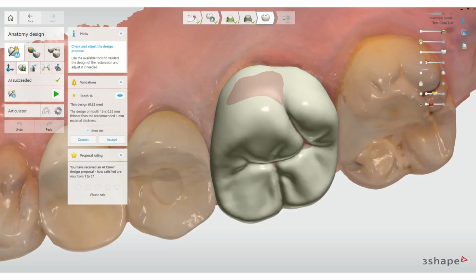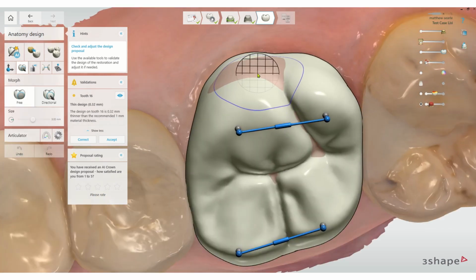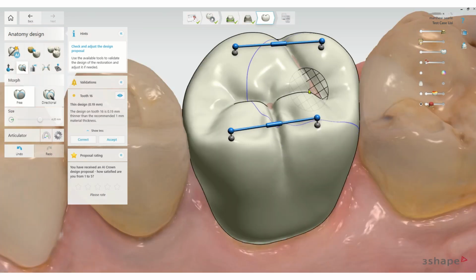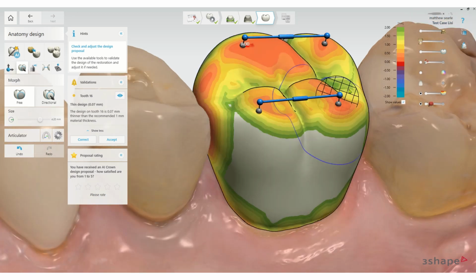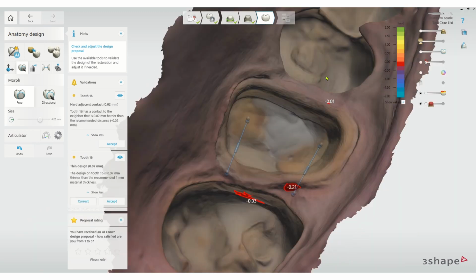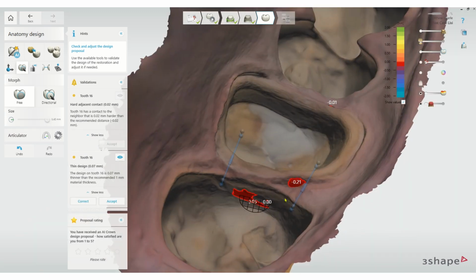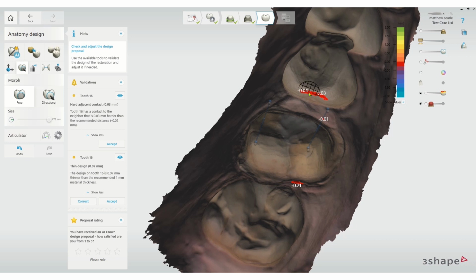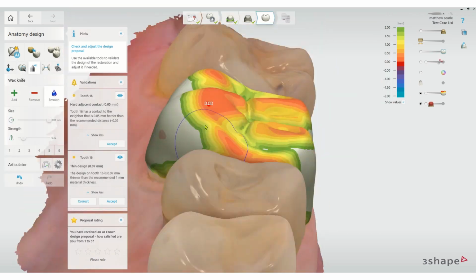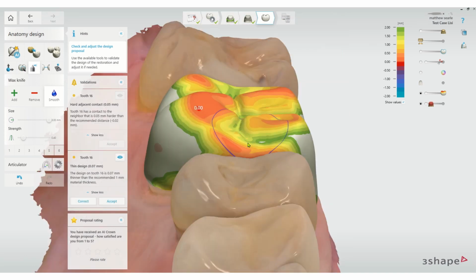We can see the areas in red are a little bit thin, so let's thicken them up a bit. We can be forgiven if this is a smidgen below minimum thickness. Let's bring that out a smidge, and let's smooth that now because I can't help myself.